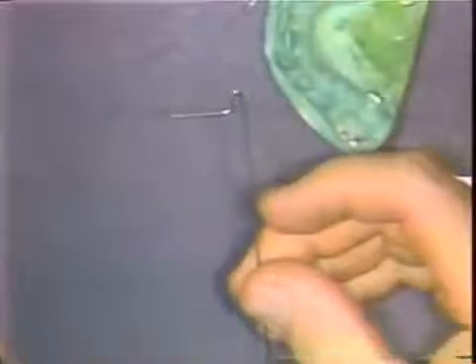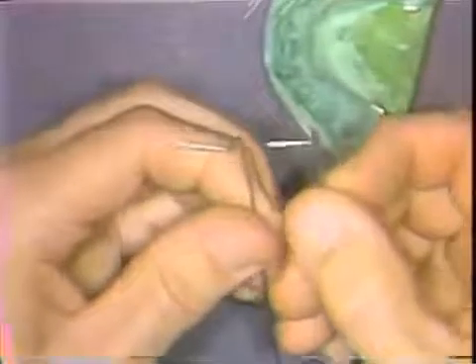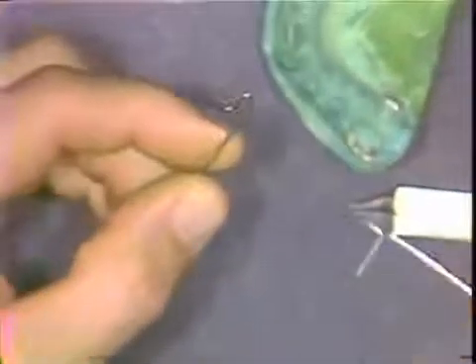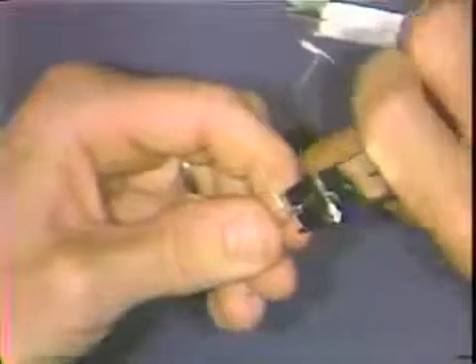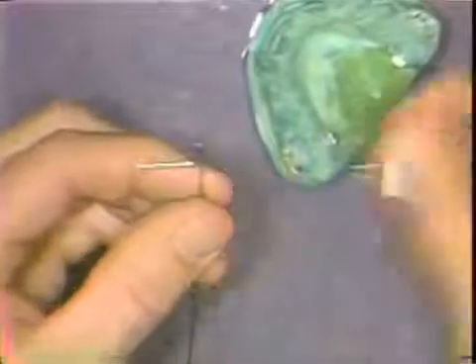The next step is to crimp the folded back portion so that it will fit securely into the lingual sheath. The crimping is done with the lingual arch plier. Several applications are applied down the length to crush it completely. That step is completed.